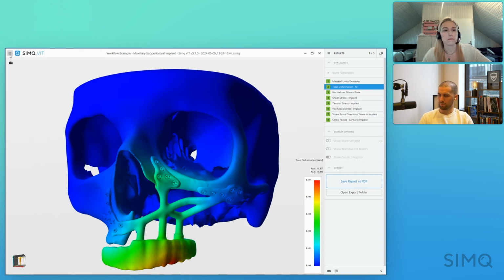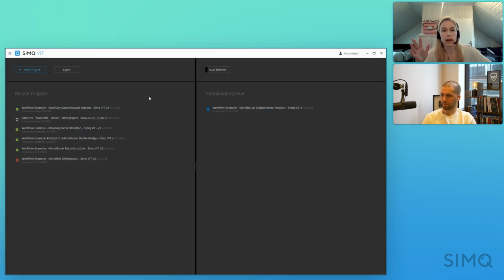Great. So I think with that, we can hop over to the dental workflow, Kelsey. Okay, great. Right. So you'll go back to the dashboard, and so this is what I was saying.